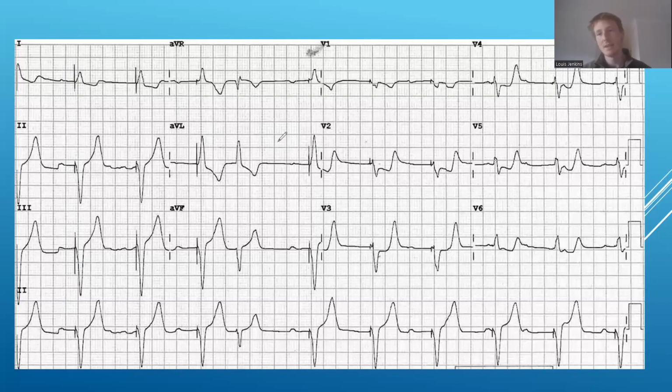And I'm just going to take the simplified Barcelona approach to this ECG because I think it's a little bit easier to follow. So let's start by going through our leads and looking for any concordance, okay? So this is discordant, AVL is discordant, and inferior is discordant, 3 and AVF are all discordant. Remember our QRS complexes and our T waves are facing the wrong way. They're facing away from each other. V1, okay, I think that is concordant, but the ST segment looks fine.